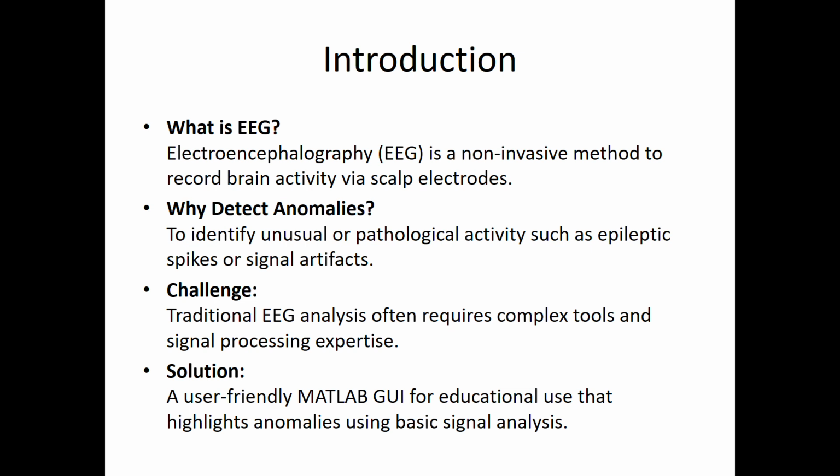complex software. The motivation behind this project was to bridge that gap by creating a lightweight, interactive MATLAB-based tool that allows even non-expert users, such as students or educators, to visually detect anomalies in EEG signals. Those anomalies often represent important physiological events like seizures or signal artifacts.